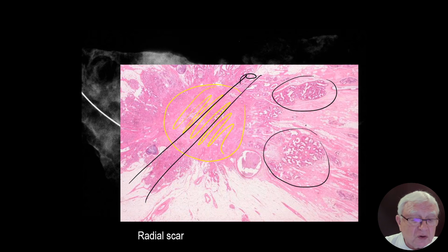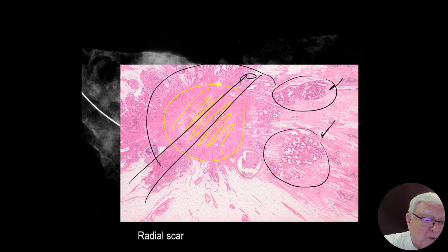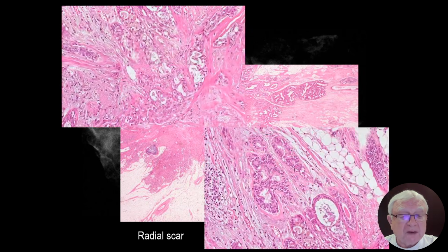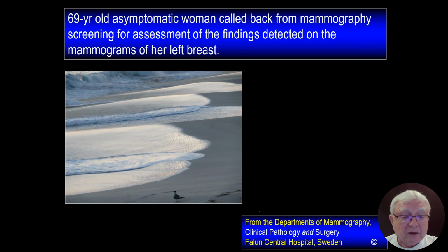This is not cancer yet, but epithelial instability, hyperplasia. There are several layers of cells. If the surgeon only takes out this one, this is still a ticking time bomb. Not a very aggressive something. You know that. Nevertheless, you see, here are the cell proliferations at the periphery. Pathology says that's still not a cancer.